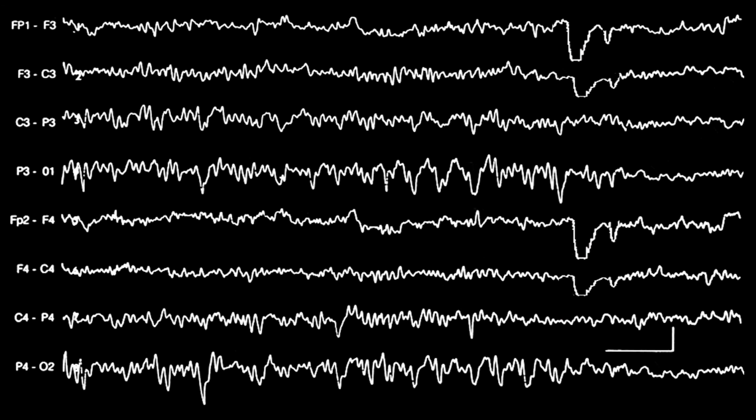When judging an activity in the posterior electrodes, always look for eye movement artifacts. Here you see that after eye blinking, the posterior activity becomes disorganized. Hence, the activity preceding can be labeled as predominant rhythm. In this case, we are dealing with a posterior dominant rhythm consisting of posterior slow waves of youth.